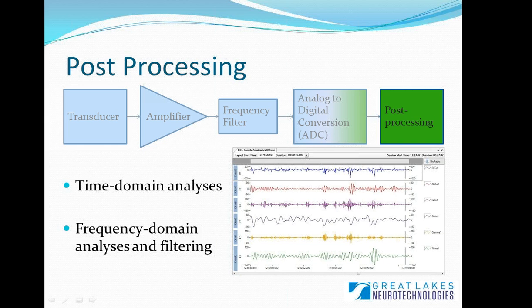And what's nice is that with the BioRadio we offer software applications that integrate both the time domain and the frequency domain. So you can view a frequency analysis of your signal, you can look at the amplitude over time. All of that is definitely available. But beyond the BioCapture software, there are several other applications that you can use to further this type of analysis and further this type of processing.